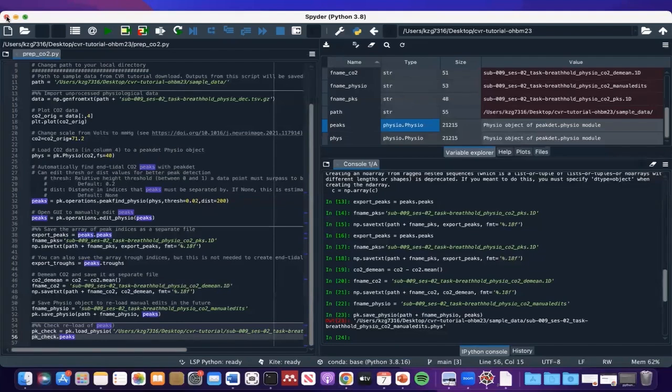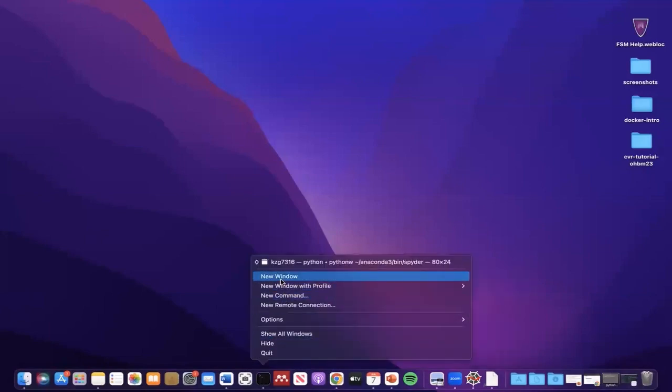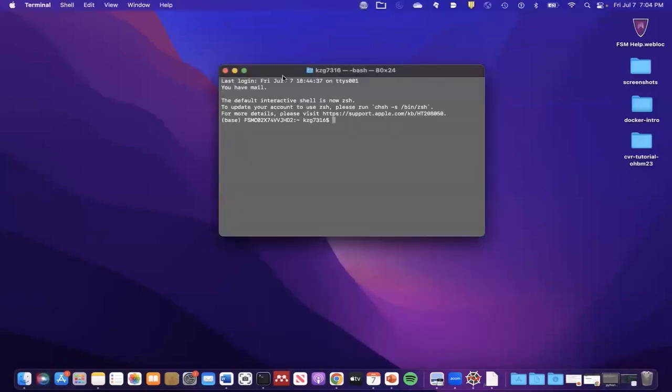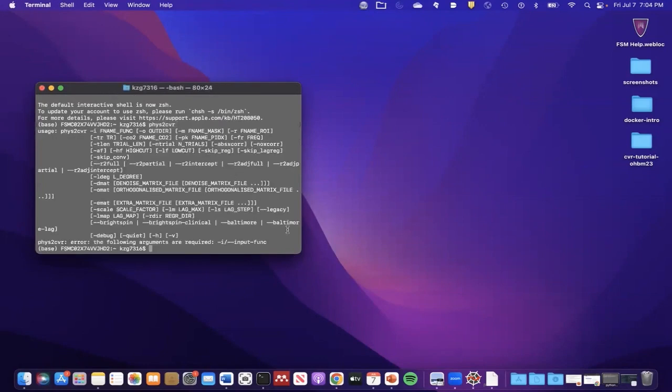So again, the first things to edit are the directories where you want to input data from, and then where you want to save data to. So the input directory is the same, except it has an extra A that we'll remove. Let me see, save that change.